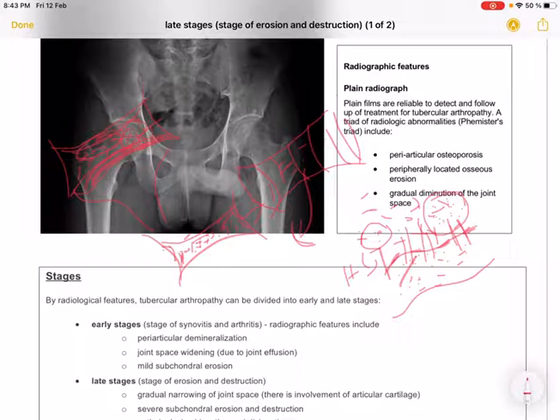Now the joint is no more widened. Now they come close to each other. The space becomes narrowed, the surface becomes irregular, and there is a fibrous accumulation between the two joints. That restricts your movement and causes the fusion of the two joints, and there will be fibrous ankylosis. In one disease, ankylosing spondylitis, there is a fusion of the vertebral column. I mean, there is a fusion of two vertebrae with each other, that limits your movement, causes pain, and causes other complications as well.